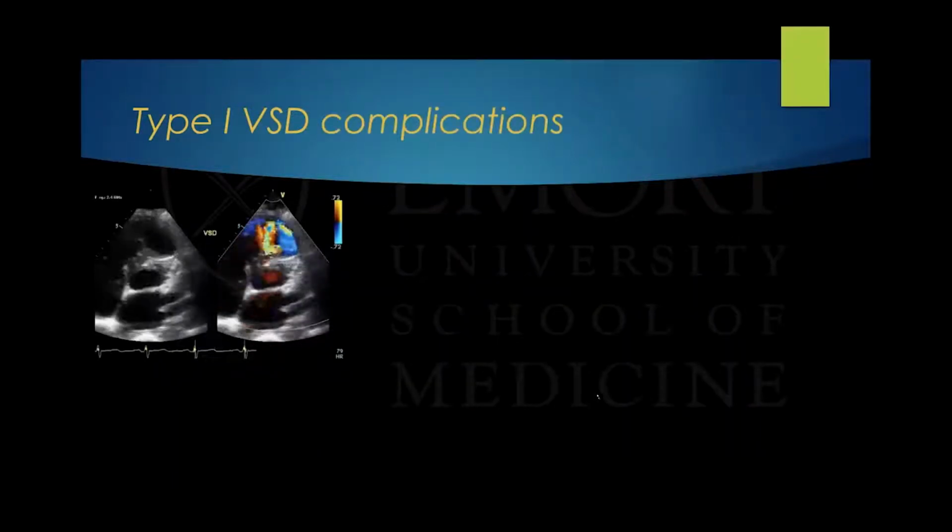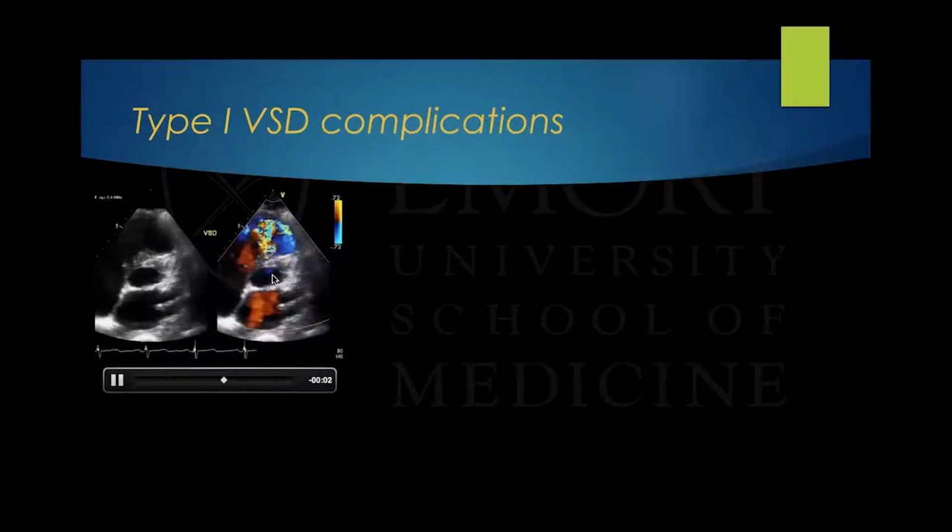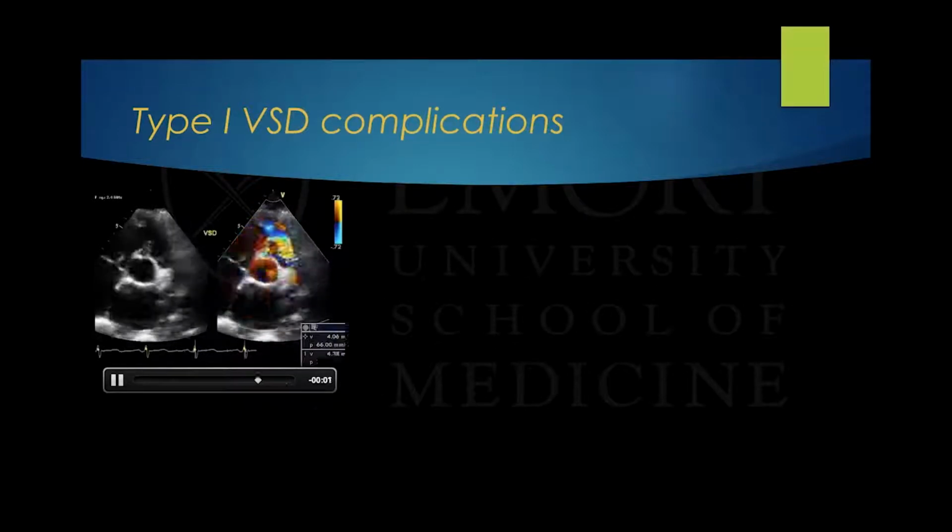And these VSDs can have some complications, and one is a rupture of the sinus of Valsalva due to the aneurysm. And you can see 2 jets by color at the level of the outflow tract. One represents the VSD, and the other one is the rupture of the sinus. And see how the flow goes directly into the outflow tract.